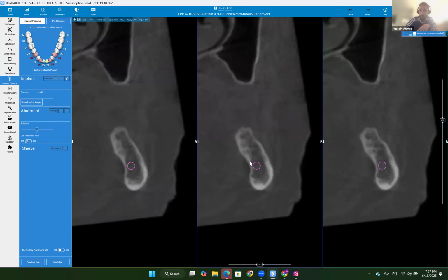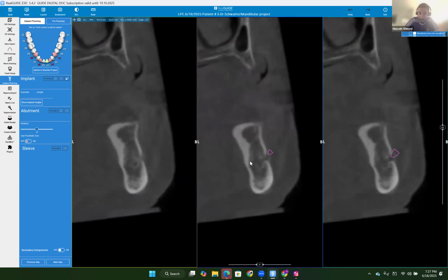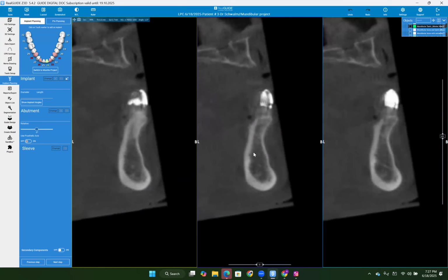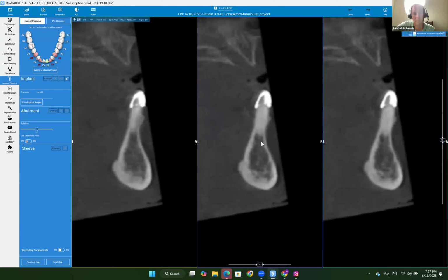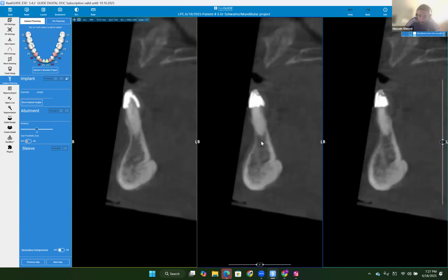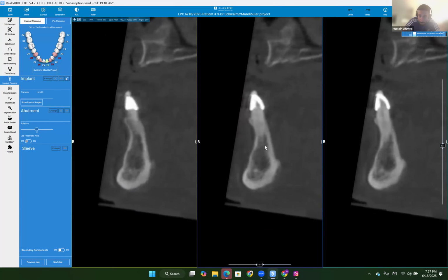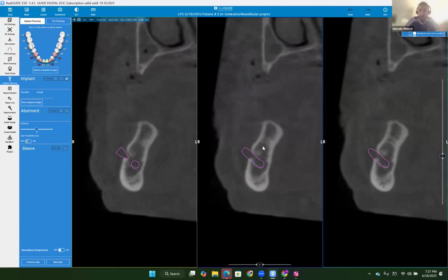So there were a few periapical pathologies related to the central incisors and the lateral incisors. Dr. Resnick, I'm going to show it to you right now, Doc. Can you see that very small periapical pathology over here as well? And as we scroll to number 25, just a little bit of a pathology. That's number 26.